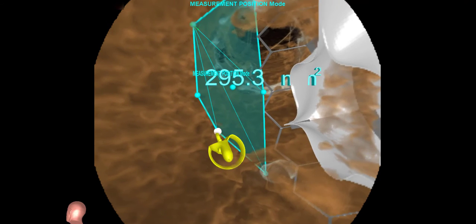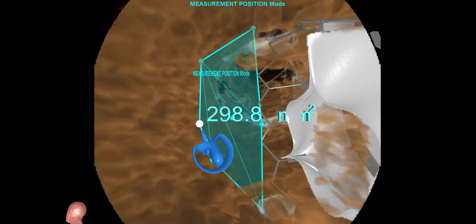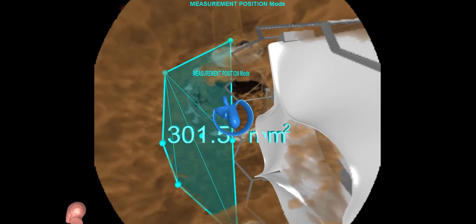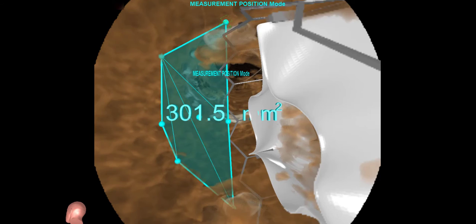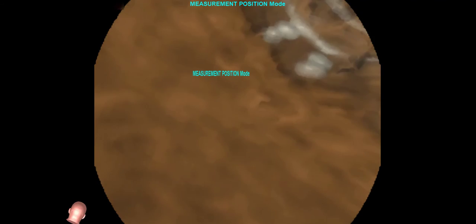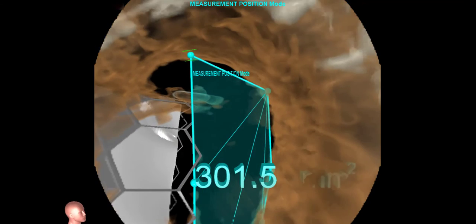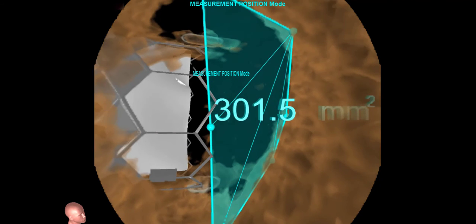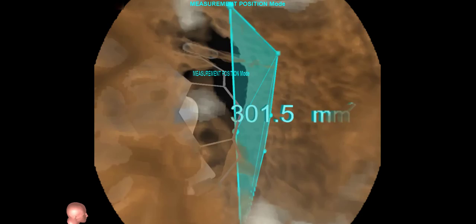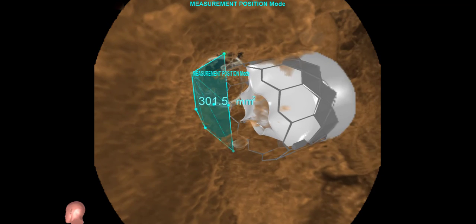As you can see here, I'm nearly done positioning the edges of the polygon, slowly moving them to approximate what the neo-LVOT area will be. Once I think I'm in the right position, I can view this plane from different angles and ensure that it in fact is measuring the neo-LVOT. That's the benefit of virtual reality. You know exactly where you are, and you can be confident of your measurement.